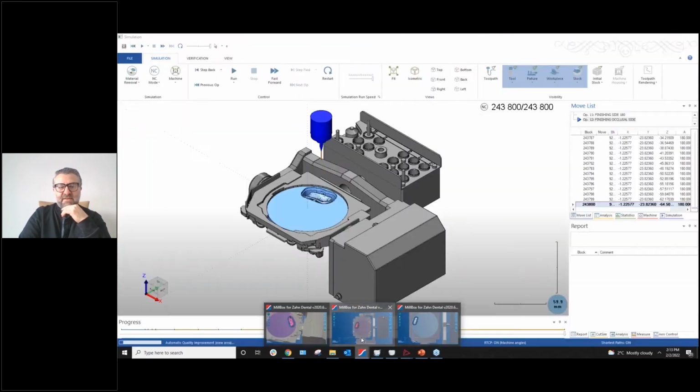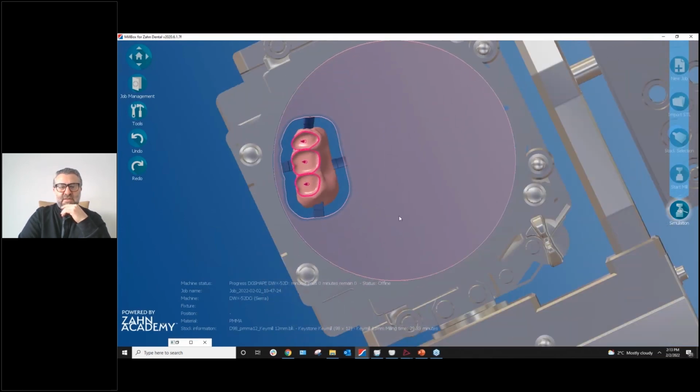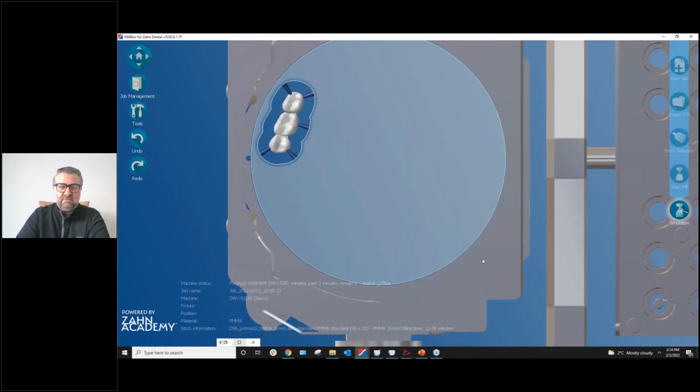If I jump ahead and I look at the Vita one that I did, which are the pocketed ones, then at this point I would have 29 minutes and 33 seconds, just a bit over the one that you saw before. However, it's again less than 35 minutes. But the most important comparison here is that you actually are going to buy these teeth carded and you will lute them without actual milling of the teeth. So you're saving the time of what you spend in order to mill this 3-unit bridge.